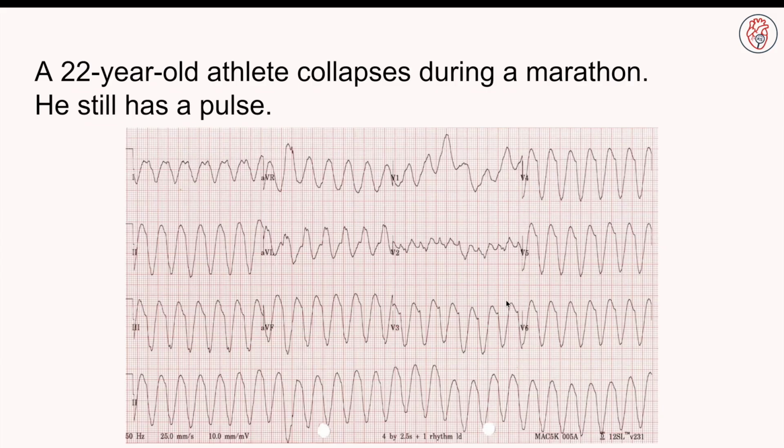Let's go back to the big one, okay? We see wide QRS. These are like our R's here, right? And this is just squiggle. Okay, so wide QRS tells us what? Tells us it's coming from the ventricles. We have this massive signal coming from the ventricles. Our atria are not in the picture. All we have is this big tachy ventricle thing happening.